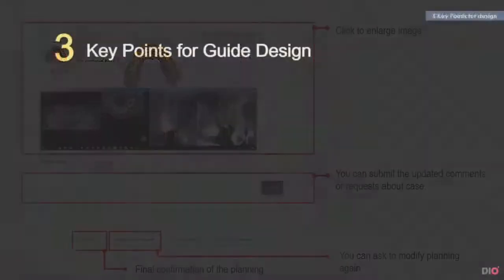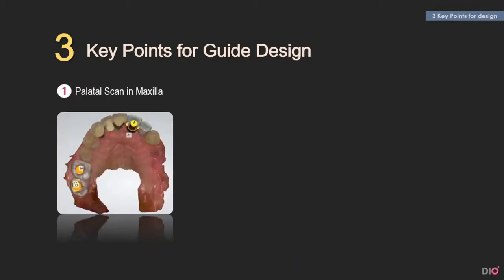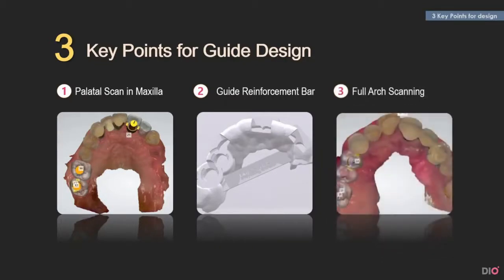In this slide, we will learn about the guide design. Here are 3 key points to know when designing the guides. First, the importance of palatal scans in the maxilla. Second, how to design a guide reinforcement bar. And third, the need for full arch scanning.